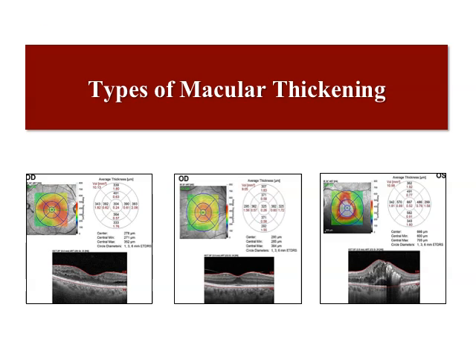What are the types of macular thickening? Sometimes we can see central sparing thickening or central involving thickening, whatever its cause. How can we describe this as a central involving thickening or central sparing thickening? If it is marked thickening, you can see it clearly with a scan only. But if we are going to discuss it numerically, it depends again on the device that you are using.